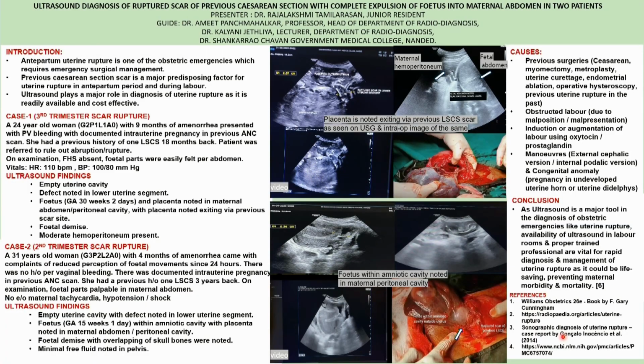So it's a dictum now that the moment you see a scar of 3 mm and you also elicit tenderness along the scar, if you get these two signs, you need to tell your fellow gynec, watch for dehiscence. I have some 10 cases, 3 mm, and then the scar dehiscence happens. So you should be categorically reporting in your reports that this is 3 mm, the scar is tender, monitor for scar dehiscence, because that will be life-saving for the mother and the fetus both.